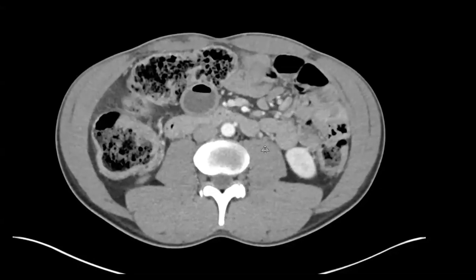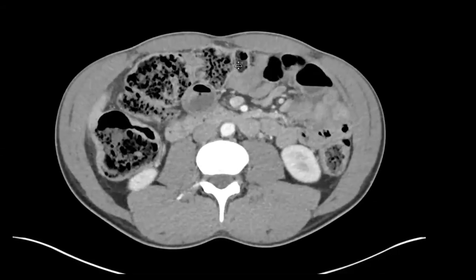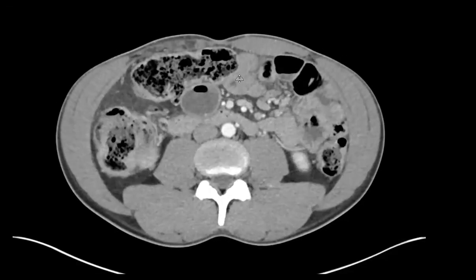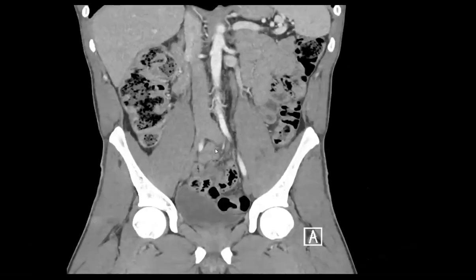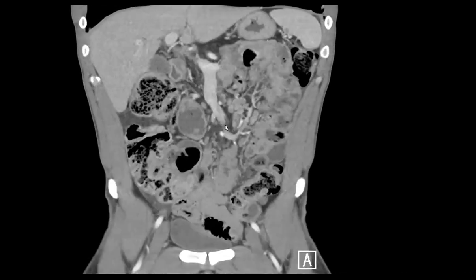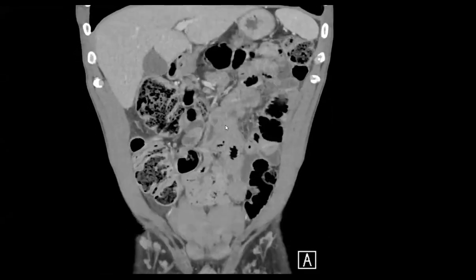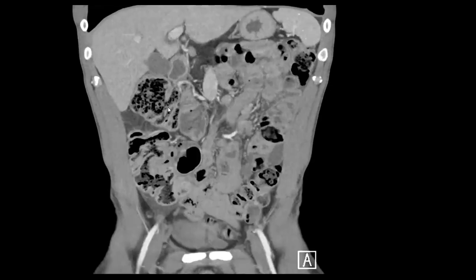Wait, I didn't know that it thickens the colon. There will be colonic wall thickening. I'm not sure why. I think it's because it's been a large capacitance for a long time, or something from slow transit. Do you have a coronal, Malak? Coronal, yes. My understanding is that because of the cystic fibrosis, they don't have the proper enzymes, so digestion doesn't happen as properly. Then in the distal small intestine, and probably the colon, it just doesn't transit as well, so it gets chronically obstructed. Yeah. And he had stopped his pancreatic enzymes when he presented.